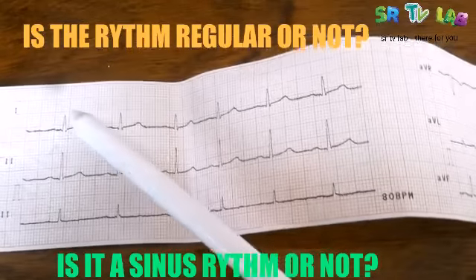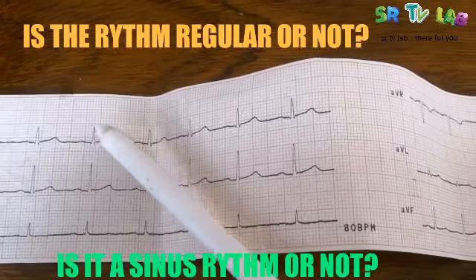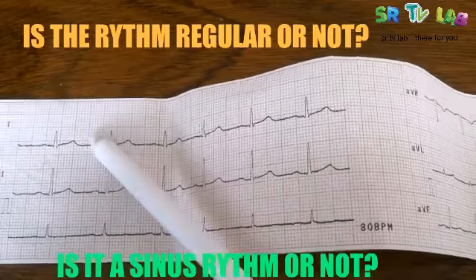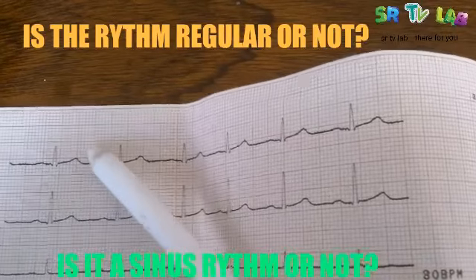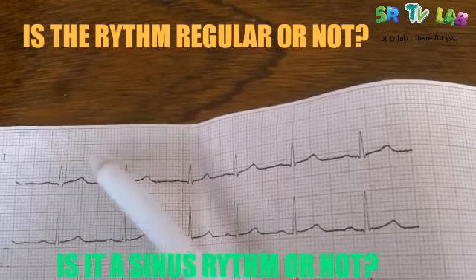Then see between 2 adjacent R waves, from this R wave to this R wave, and from this one to this one, and from this one to this one. Good. Here are 3 big squares plus 1.5 of the small squares.